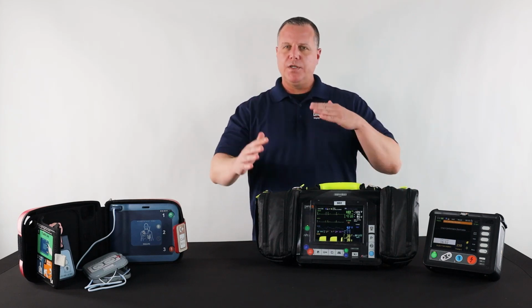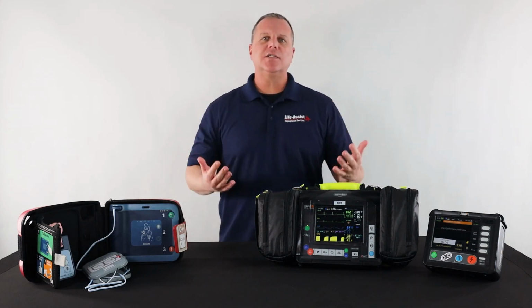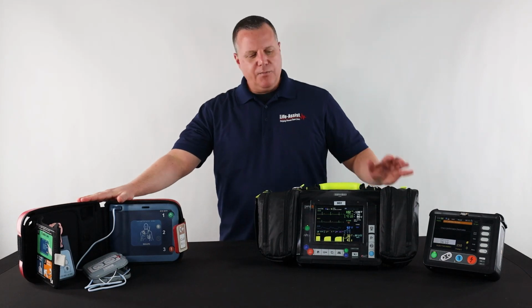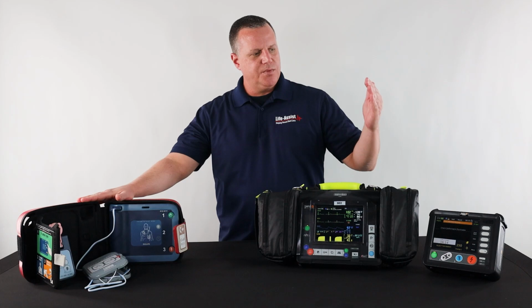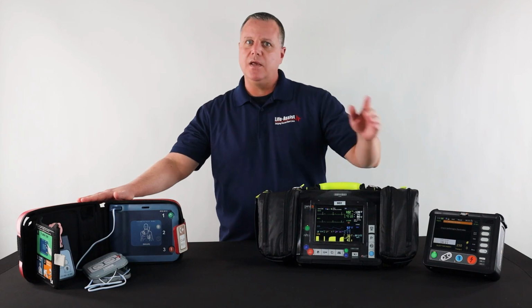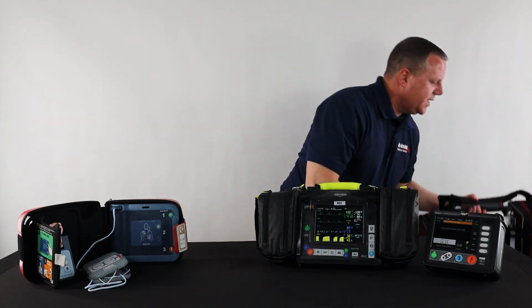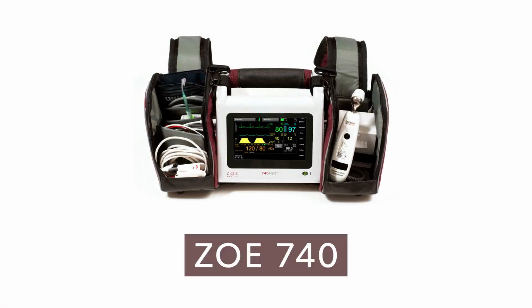So now what I wanted to talk about just briefly is what if you have a customer who says, well, I have an AED, I would like a cardiac monitor, but I don't need all the bells and whistles. I don't need the ability to do all the advanced cardiac interventions that we talked about. Well, I got a solution for you. So this right here is the Zoe monitor. You may have heard of it or seen it.